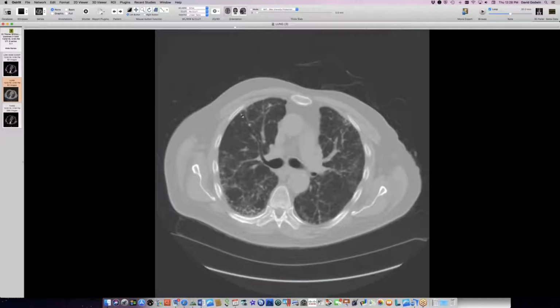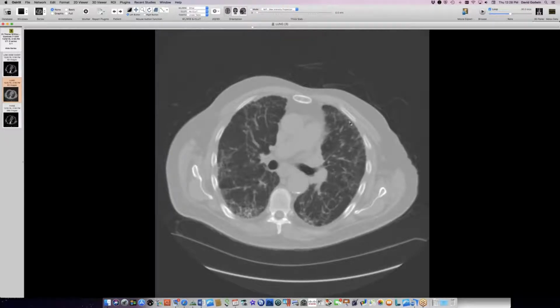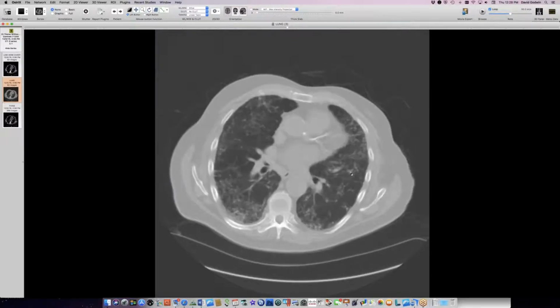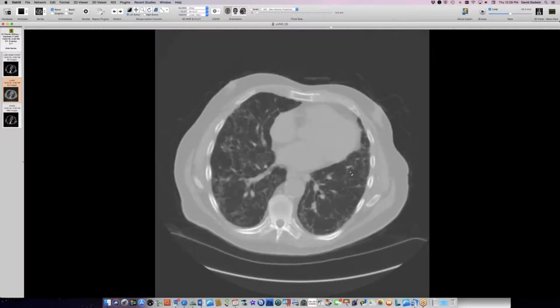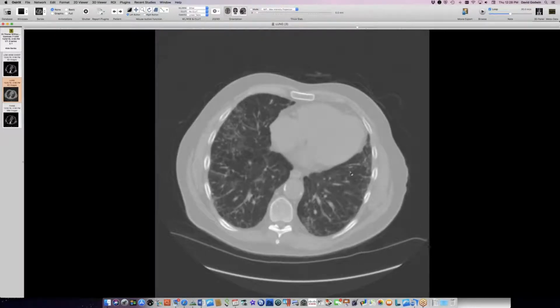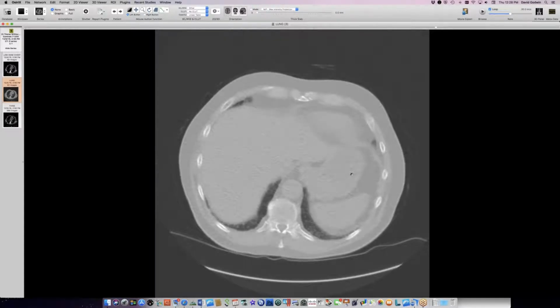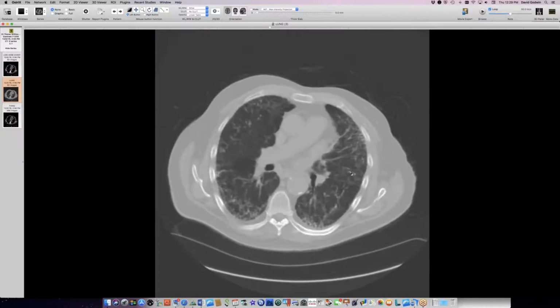Here you can make out individual nodules in this sarcoid-like peripheral, subpleural distribution. Things get kind of lacy and stringy here. It's hard to be sure that this is fine nodules arranged in lines versus more of a reticular pattern. He was biopsied, but we've not been able to get the results, and I think the biopsy was done for something else. So we have not established that this is a granulomatous process, which I suspect it is.